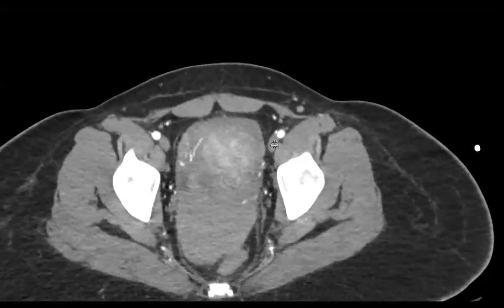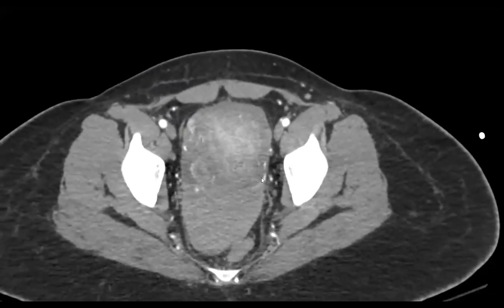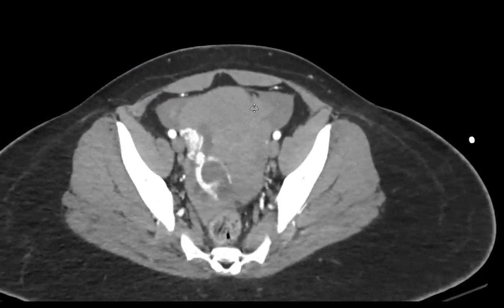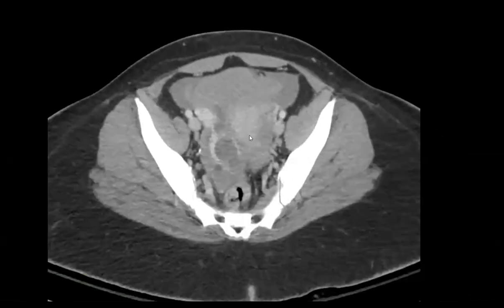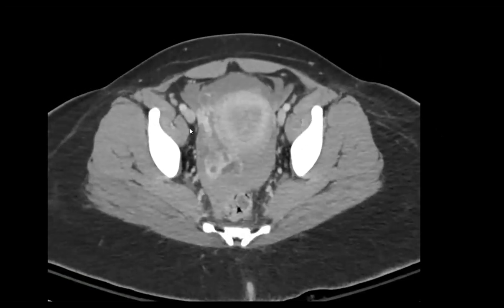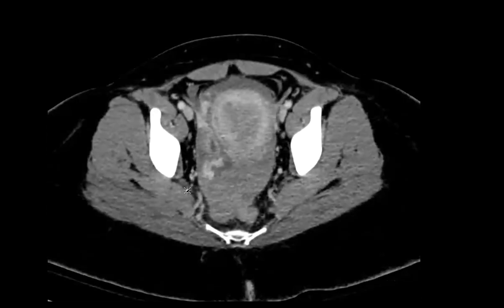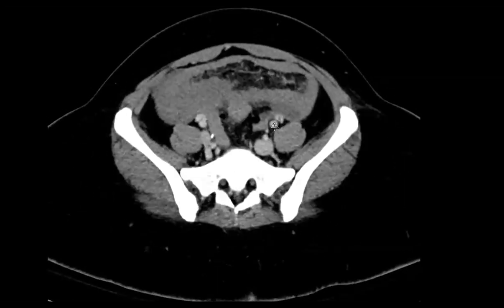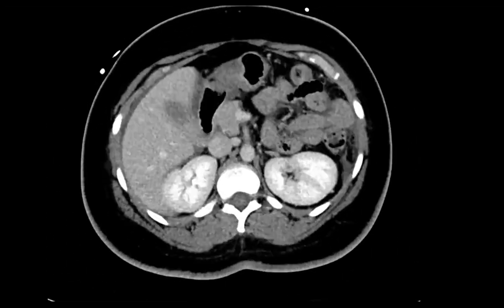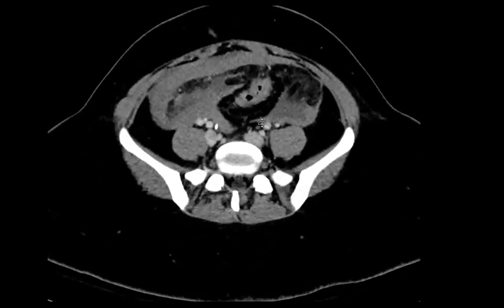Exactly. So this was a ruptured ectopic, which we see all the time on ultrasound, but I've never seen one on CT. And this was a double phase, arterial and venous. So we see here a markedly vascularized right adnexa that's actively bleeding into the cul-de-sac, and a large volume hemoperitoneum. She was rushed to OR and she had a ruptured ectopic from the right that was actively bleeding.